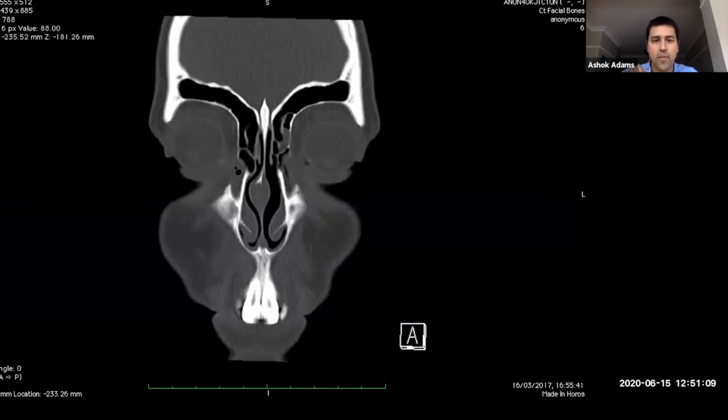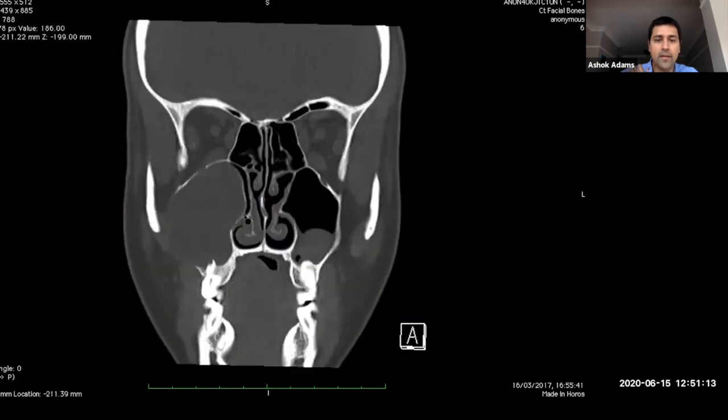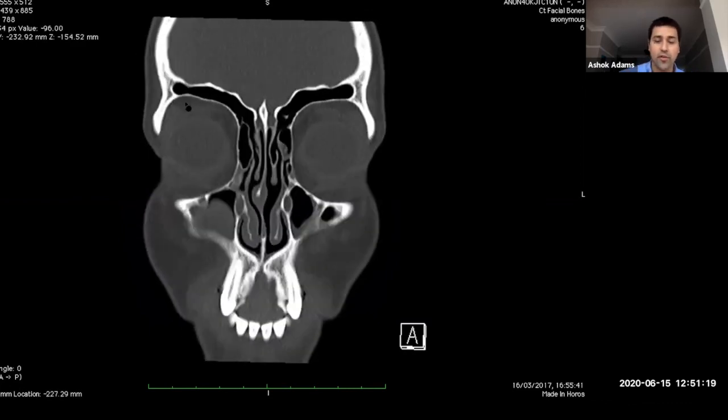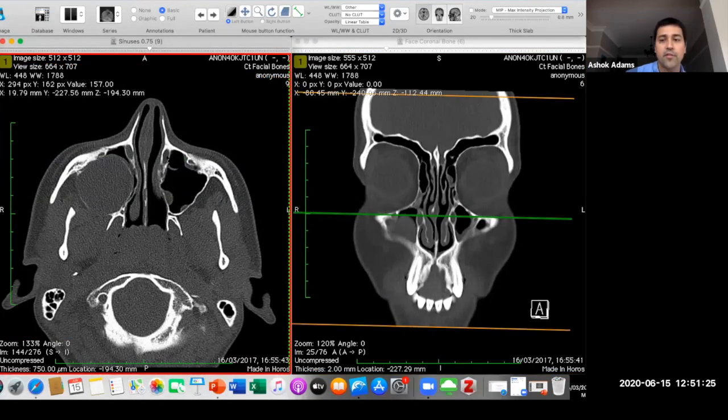So typically the main situation where I will comment is trauma, and we've had a couple of tumours that have gone from the orbit down the nasolacrimal duct, and, as I said, any sinonasal tumour that's gone the other way around. But if it's opacified, it's not always abnormal, as it can be full of tears or it can be aerated at the time of the scan.